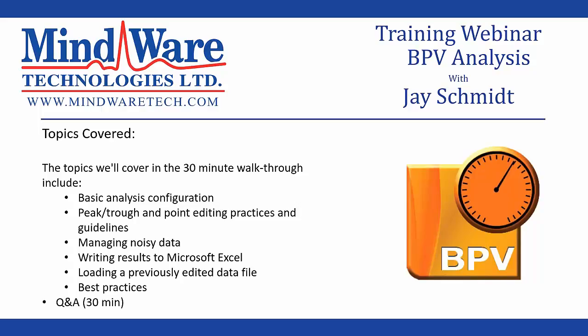Okay, so the first things we're going to do is look at some basic analysis configurations, some peak and trough editing, just how to go through there, some techniques. How to deal with some noisy data. We have some edit points we can show you, and how to deal with them. We're going to export the data to Excel and show you what that looks like. We'll make some edits to our file, and then we'll load that previously edited data file that's created. And then we'll show you some best practices and tips.